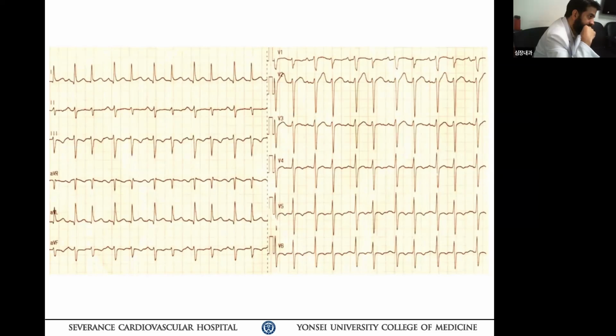Okay. Dr. Park? My thoughts. I think it is APC function, because if you see in the T wave, it's... Which lead?